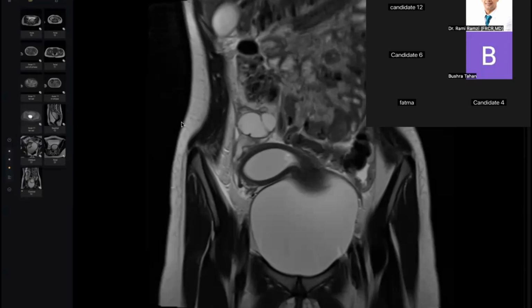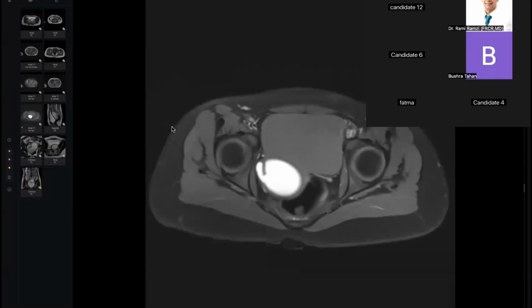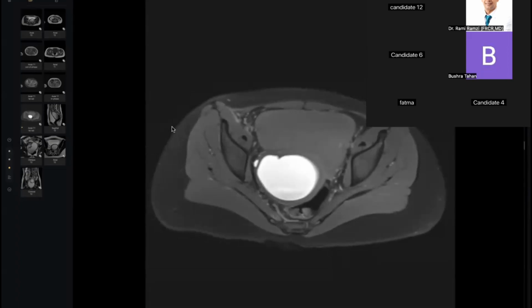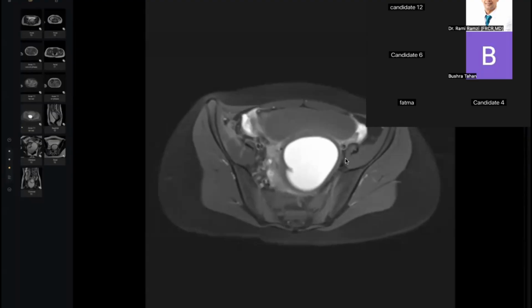History. From the beginning, keep the history. I said from the beginning, she has abdominal swelling and cyclic pain. I'm not talking about an acute case. Then when you see something like this in the axial, follow it. It is impossible that the appendix reaches this size and is inclined to the left like this, completely insinuated between the bladder and the rectum.